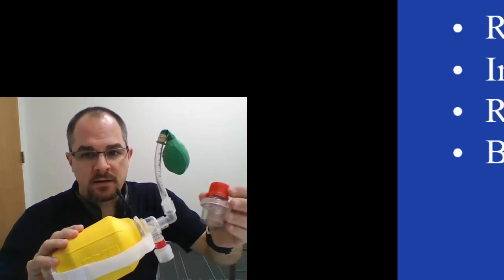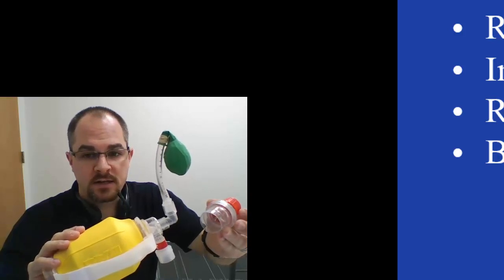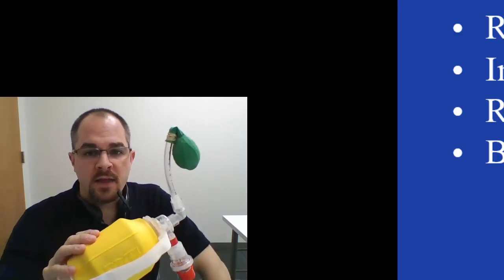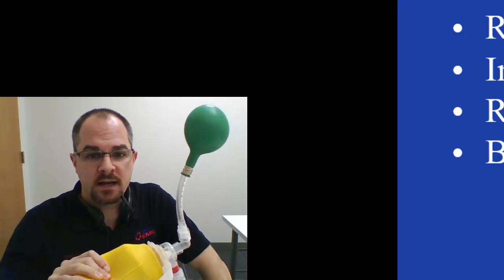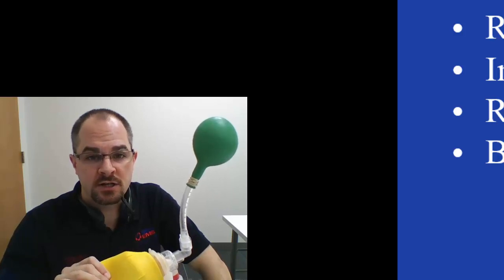If we add this device called a PEEP valve, which approximates a CPAP, and then take a breath, we'll see that as we exhale, pressure within the alveoli is maintained. This allows additional oxygen exchange to occur.